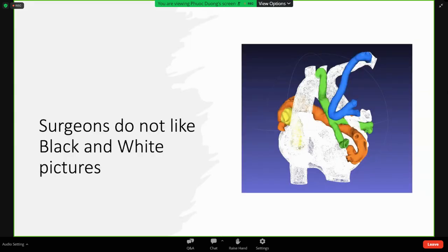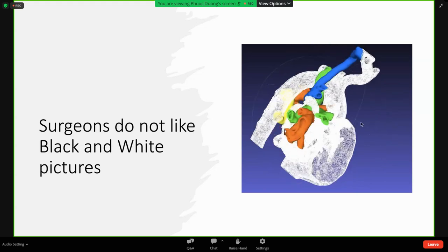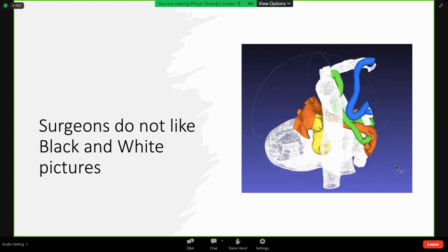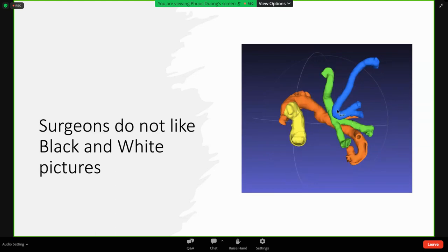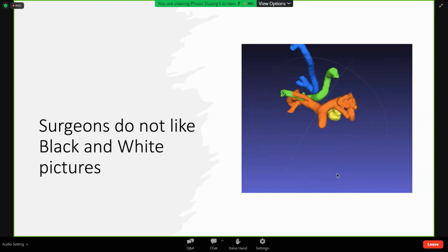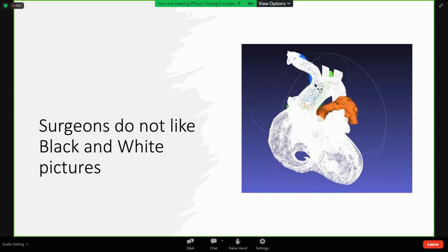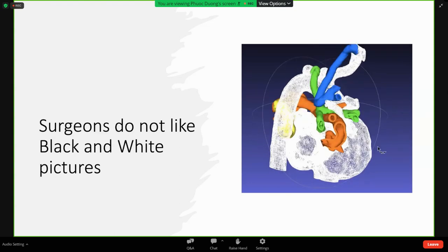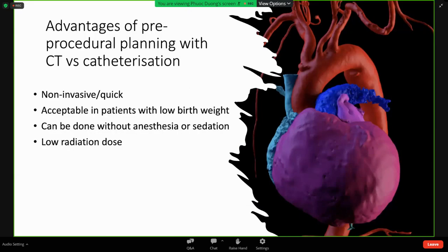The good reason that we advocate CT is that with CT imaging, you can provide a roadmap with very, very clear delineation of the MAPCAs, to assist with the surgery. And surgeons particularly love all these colorful images, and you can actually see the roadmap. You can interrogate them, turn them on and off, and do different types of measurements.